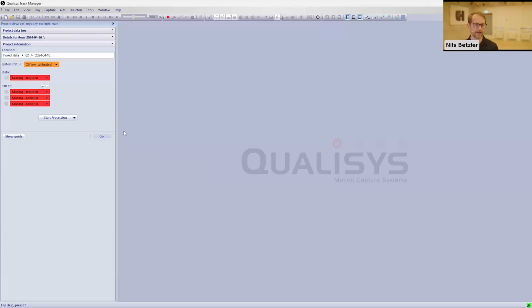Okay, and what's coming up next is the data collection pane. And you can see that we have prepared this project for 1 static file and 3 walking files. And this is something that is specified in a simple text file that anyone can modify for these open examples.